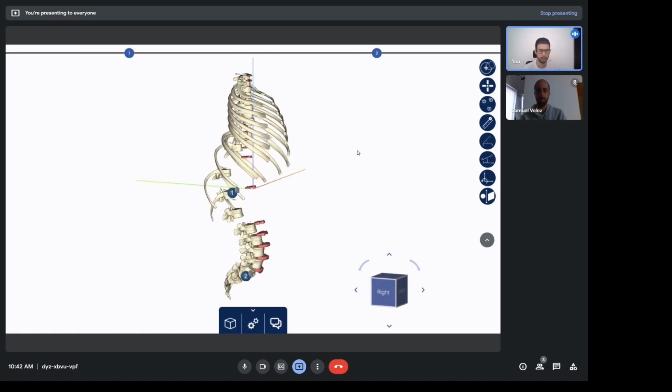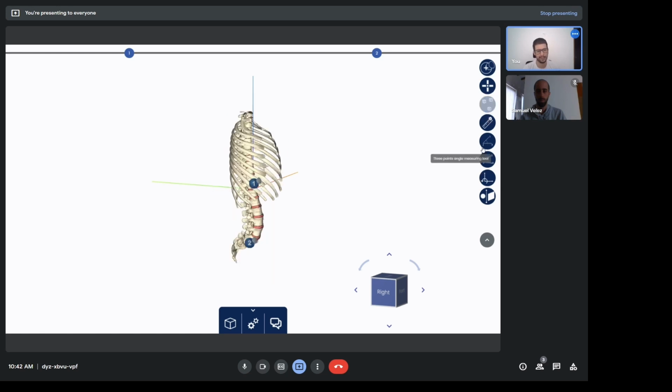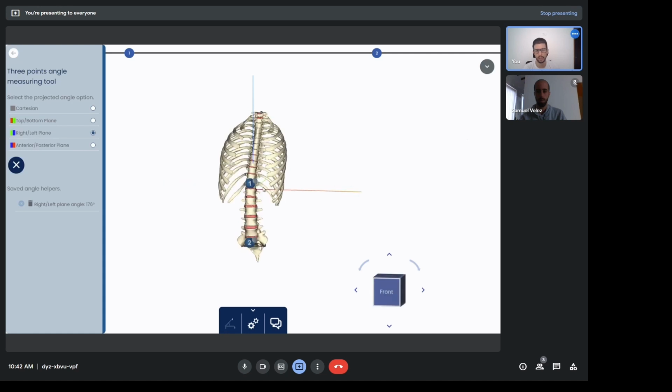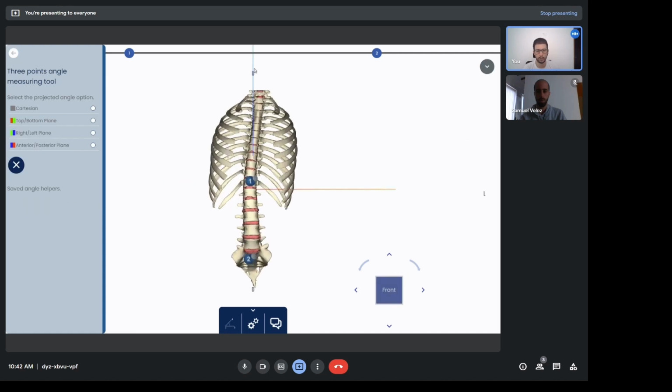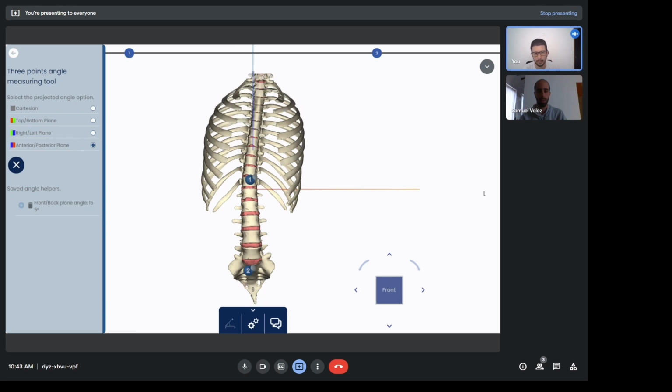One of the tools that I like the most is the angle dimension tool. I'm going to explode back and select the angular dimension tools, and these are very useful to measure angles. We have two different strategies. We have the 4-point tool, or angle in between two lines in space, and the 3-point tool, which is angle in between two lines in space that intersect at a common point. So you can create here a 3-point angular measurement.